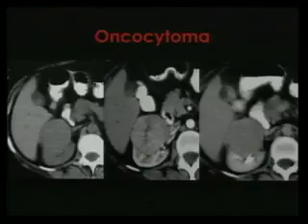Remember, I said oncocytoma is a vascular tumor. In this case, we have heterogeneity and hypervascularity with a central low density focus compatible with the scar that I mentioned before. The problem is that most oncocytomas do not show this pattern. If you have this pattern, you probably suggest oncocytoma over renal cell carcinoma.